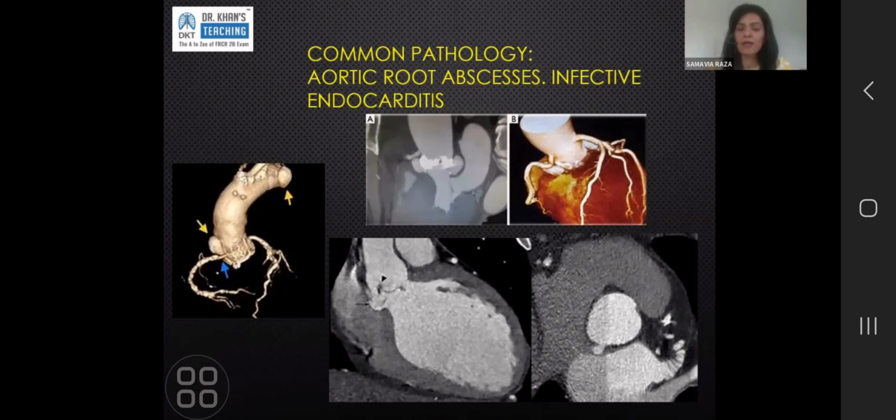You're describing a collection. The other question I am predicting some of you may ask is, why is that a pseudoaneurysm, not a true aneurysm? Because a true aneurysm in the aortic root dilates the aortic root. It doesn't just create small outpouchings. They can in some connective tissue diseases, but even then the likelihood of the whole thing dilating is higher. In a true aneurysmal aortic root, when small outpouchings do form, you have evidence of why they've formed.